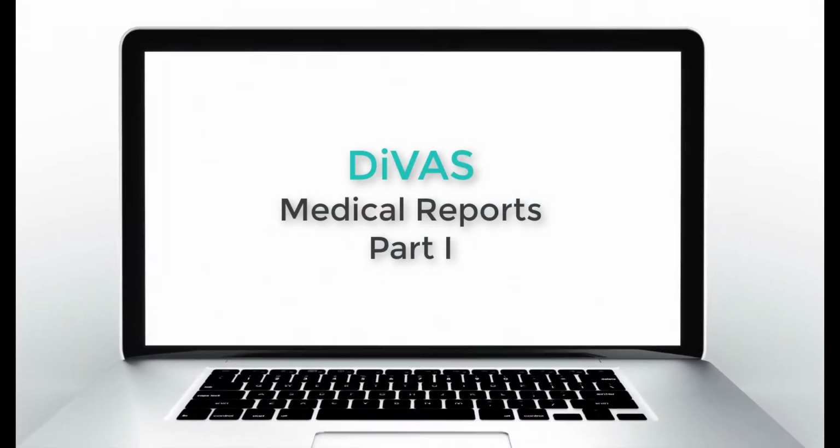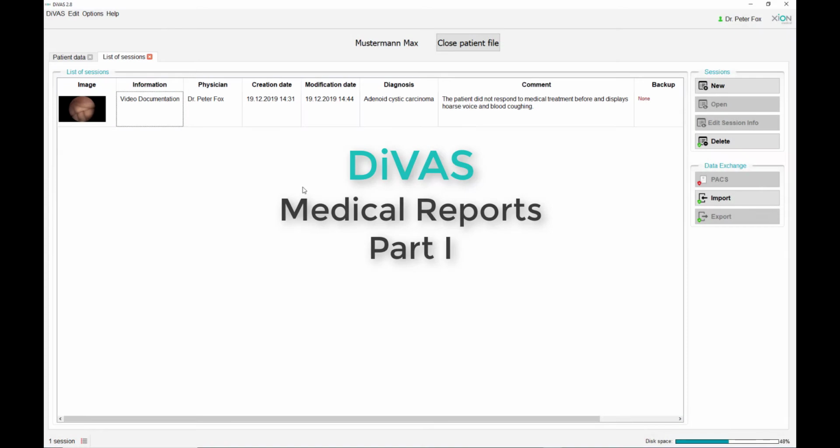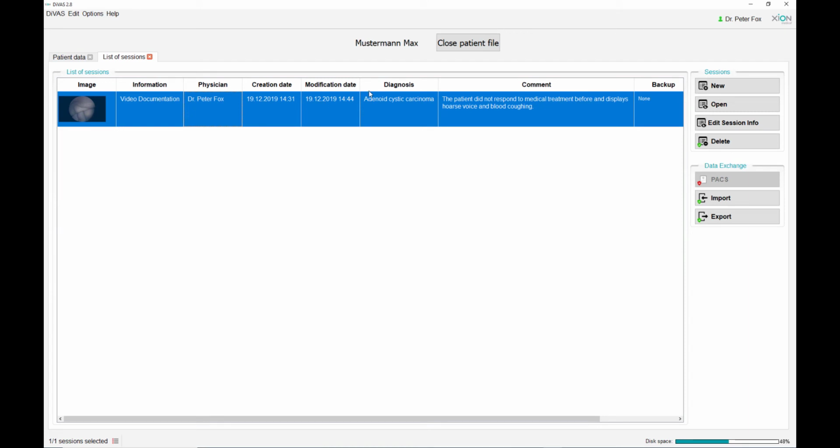Welcome to Medical Reports in DiVAS 2.8. Today we'll be looking at generating our own customized medical reports. So let's dive into it.